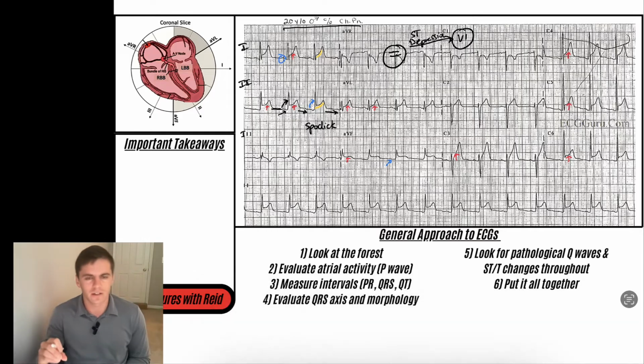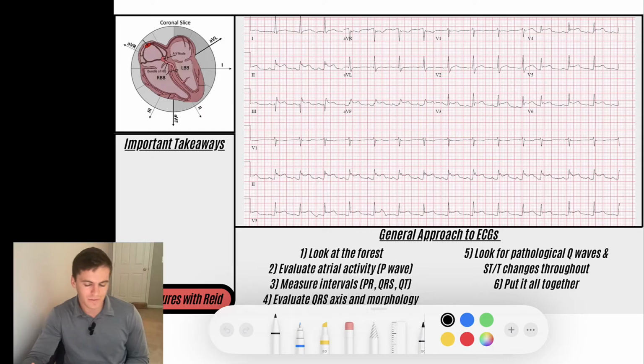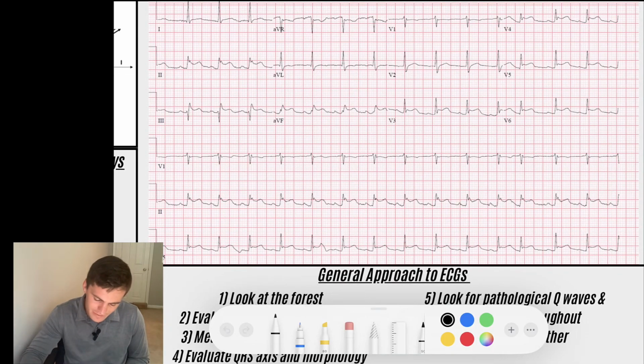Remember, this is a very often missed diagnosis. So the ECG is just adding or subtracting data from what you think is going on with the patient, right? This is not the end-all be-all. This is another example of maybe one that's not as obvious, right? So we've got a sinus rhythm here. It's fast.